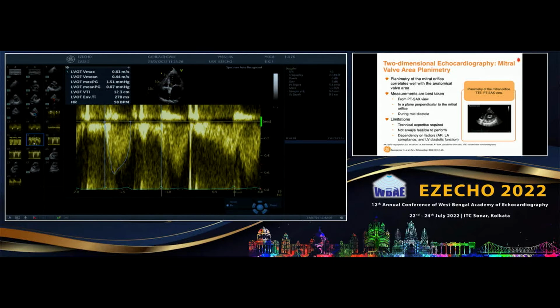So when it is 4, then I know that the area is 1/4 of the LVOT. So this is important in the case of a bioprosthetic valve or metallic valve. Look at this DVI. That is a very simple way, and you are not assuming anything, and Doppler is completely reliable. In fact, in a prosthetic valve, it has to be done.